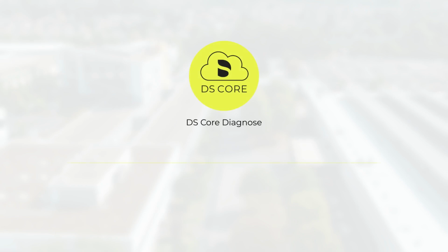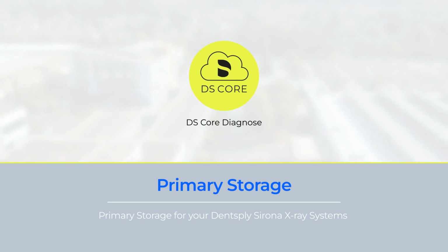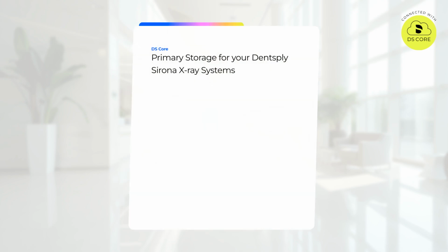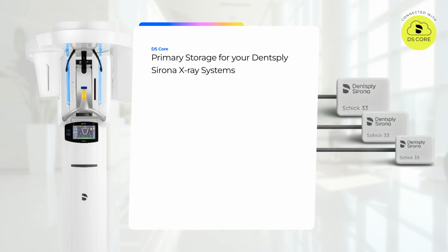Welcome to Core Diagnose. In this tutorial, you will learn about our primary storage extension for Dentsply Sirona X-ray Systems. Core can now be used as primary storage for all your Dentsply Sirona X-ray devices.